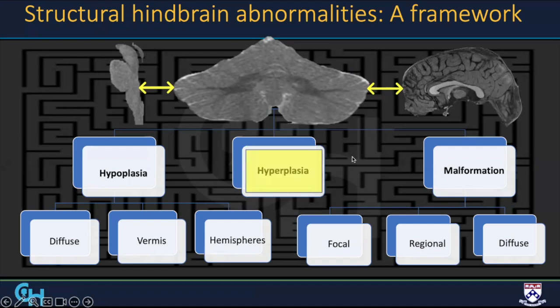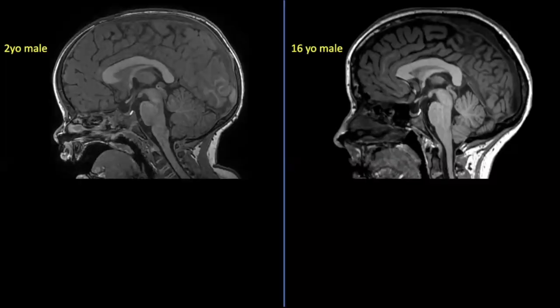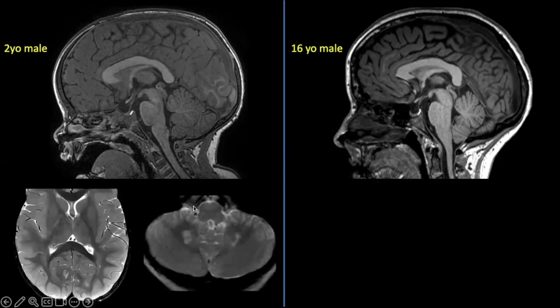All right, so if you have a cerebellum or brainstem that is too big, the next order of business is to determine if it is isolated or if it is part of diffuse brain enlargement, as in these 2 syndromic examples that I'm going to show here. In both, the cerebellum is overgrown and the hemispheres fill the usually unoccupied vallecula with tonsillar extension into the foramen magnum, right? Now, additional clues to help distinguish these syndromes are the hyperintensities on T2-weighted images in the globi pallidi and the thalami and the deep cerebellum here on the left in this patient with neurofibromatosis type 1.